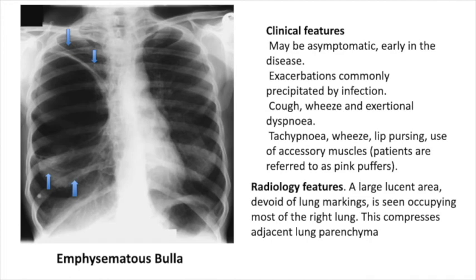I am also making emphasis on the important things you have to know so they are very clear. The rest is also important, but you have to look for it on other sites, YouTube or Google, like I said. Another disease you are going to see in your career your entire life is emphysematous bulla.